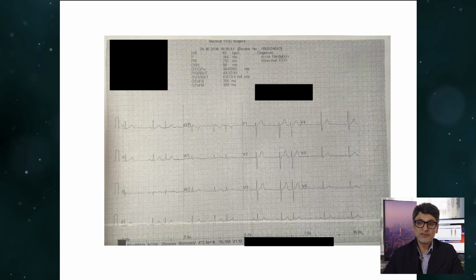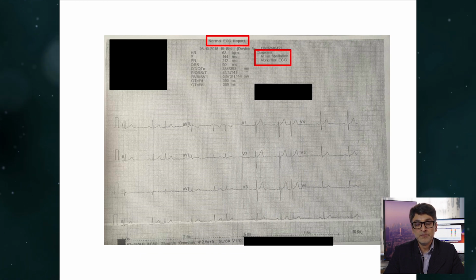And on this slide, you'll see this is quite a tragic case of a patient who was anticoagulated on the basis of an irregular pulse. An ECG was appropriately performed because you cannot diagnose atrial fibrillation on the basis of an irregular pulse. You have to have an ECG demonstrating the findings of atrial fibrillation, which are no P waves and an irregular heart tracing.